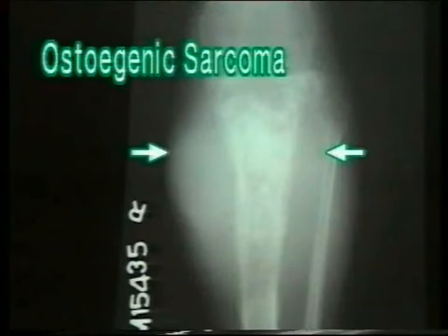This is an X-ray of the upper end of tibia. First note the large soft tissue mass on all sides of the bone, suggesting a bone tumor. The bone shows many osteolytic areas, that is, the tumor is destroying the bone. A close inspection of the bone margin shows bony spicules at right angles to the bone radiating into the soft tissue mass. This is the sun ray appearance of an osteogenic sarcoma.